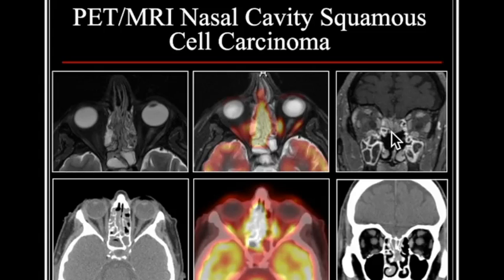So the tumor has sort of an intermediate gray enhancement, whereas the nasal mucosa is typically more enhancing than the actual tumor itself. On the non-contrast CT images, it's pretty hard to separate tumors from inflammatory change. It's maybe a little bit more CT hyperintense.